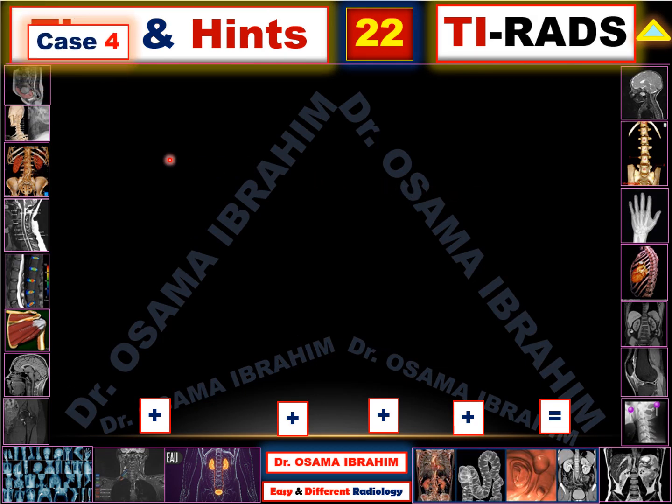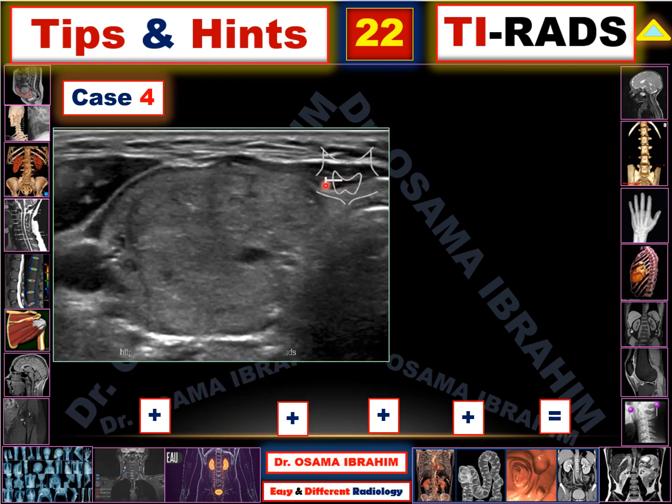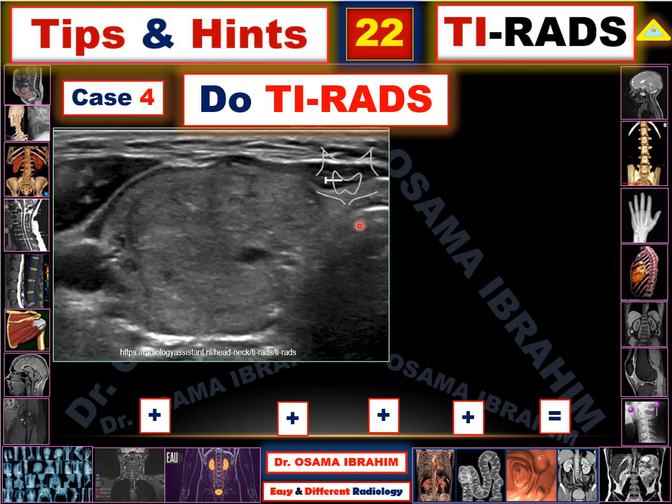And I will give you one more case to do TI-RADS yourself, and these are the nodules in the thyroid gland. Can you do the TI-RADS for these nodules according to the 5 categories?